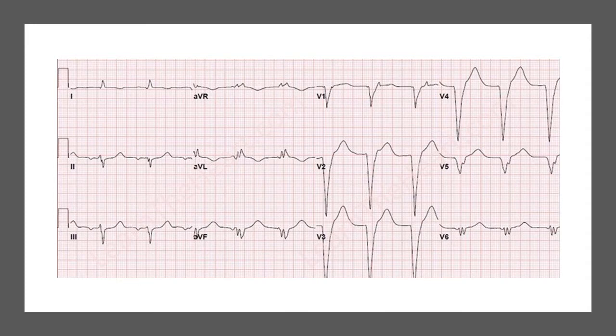Okay, hopefully you're starting to get these. This is the last example. I want you to take a look at this for a second. Pause the video before I give it away.